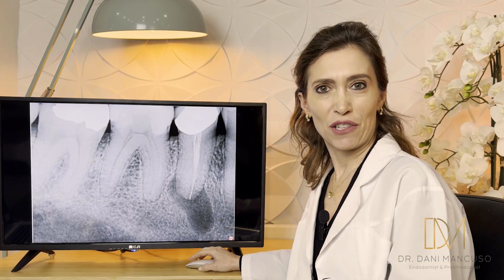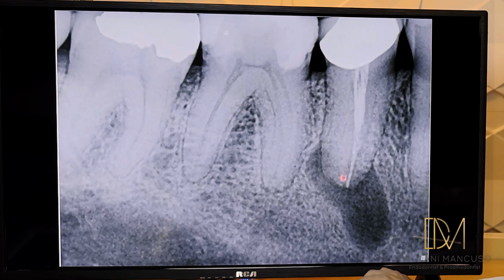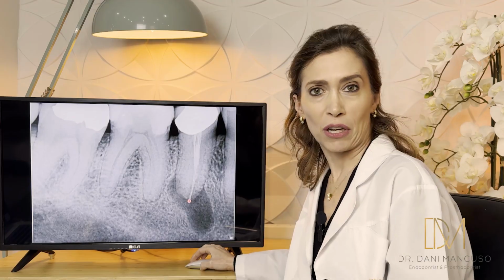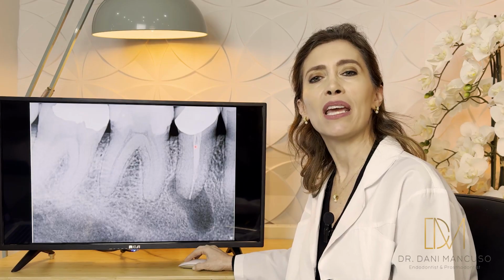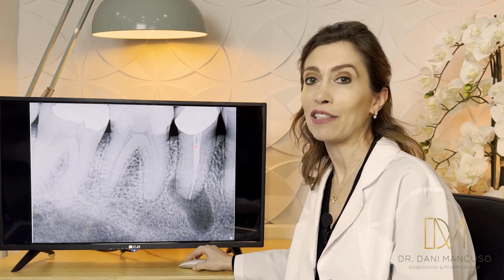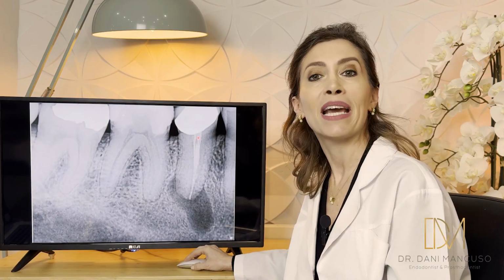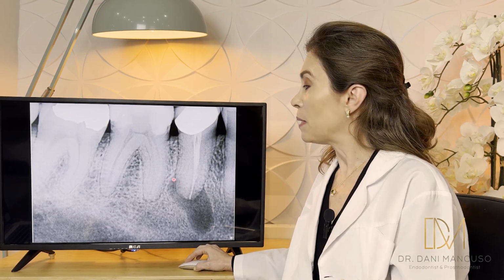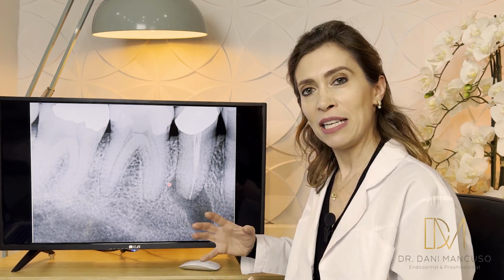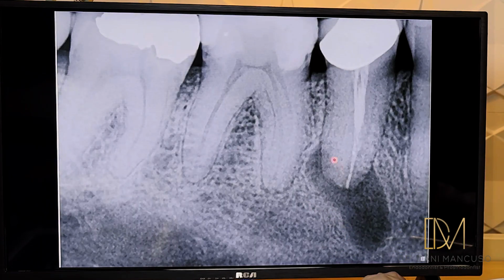This patient was referred to us. He had a root canal treatment done. It was to the correct length, but you could see lots of spaces. Probably it was a single cone with lateral condensation, as we can see few probably accessory GP points. The periradicular lesion was off-centered, and I could see that there was something over here.